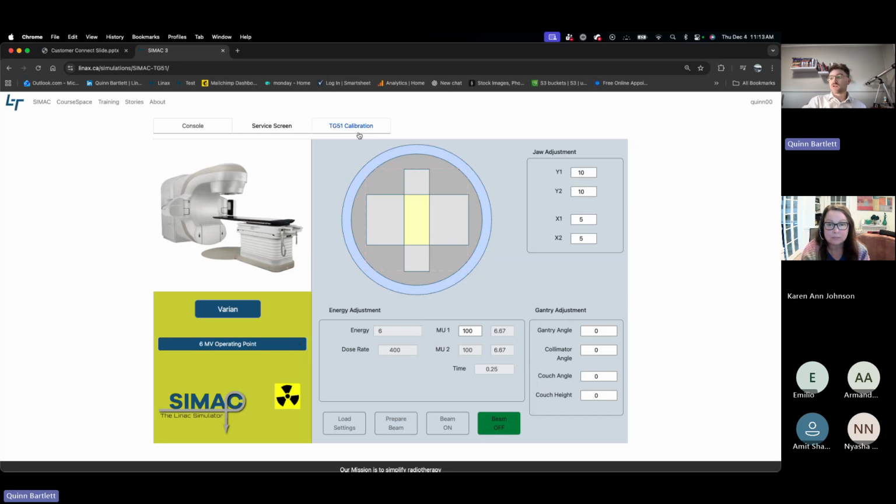And then it really allows them to see it physically, see the jaw field size changing, understand which jaws are closer, see them calculate it, and actually get their hands on it and grasp the concept a lot smoother.